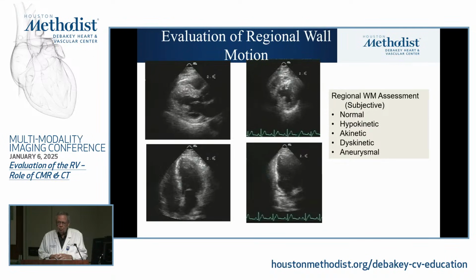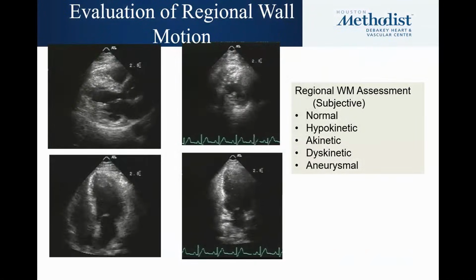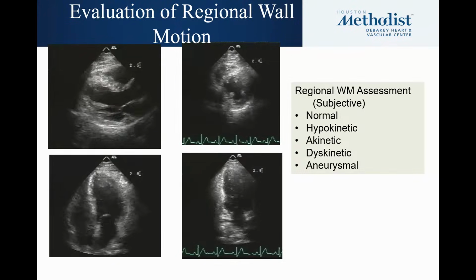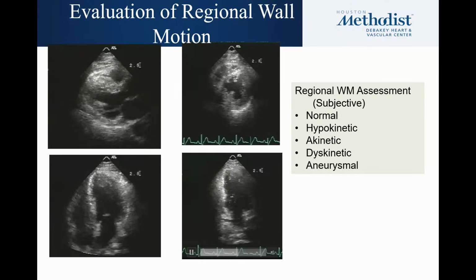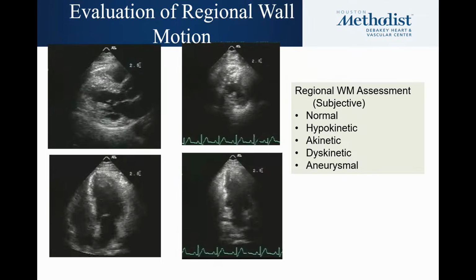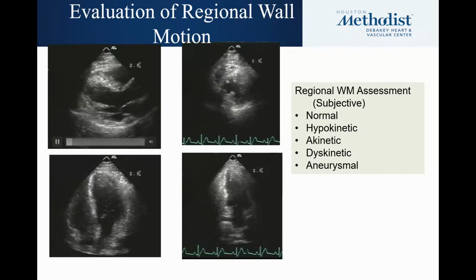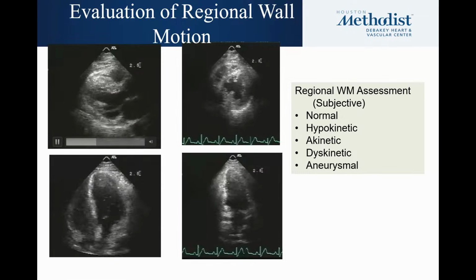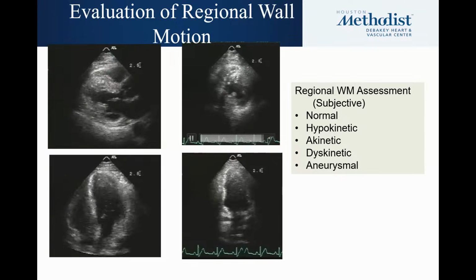All right, so we're going to then use echocardiography to detect a change or a new development of a wall motion abnormality during stress, which indicates ischemia. So let's start first by looking at the regional wall motion. This is a nice example of not ischemia, but chronic abnormalities in the RCA territory. We evaluate regional wall function by looking at the degree of thickening of the muscle, the movement of the endocardium towards the center of the cavity, and we also look for sometimes geometric distortions.